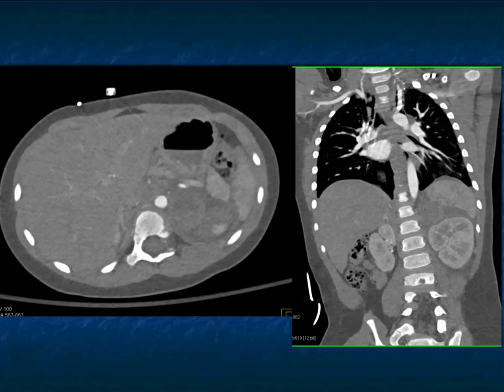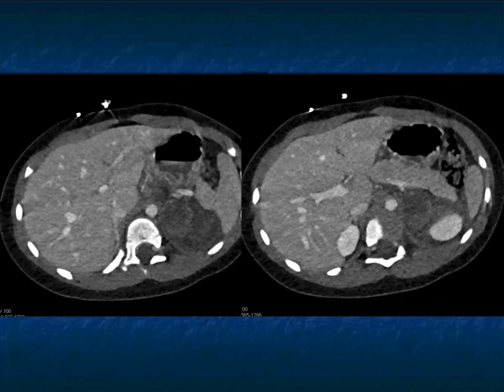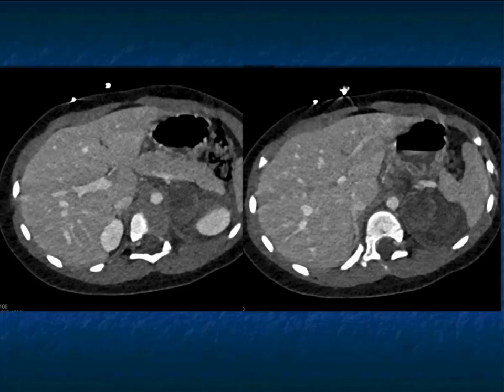The right adrenal, you can see, looks okay. There's blood tracking around the kidney. You look carefully also for spine injury, spleen injury, kidney injury. You can see it very nicely here. Now, if you did not have a history of trauma, you would go through the differential diagnosis of an adrenal bleed. And in this case, you even thought about the possibility of a mass that was underlying that bled. But with trauma, that was the cause.